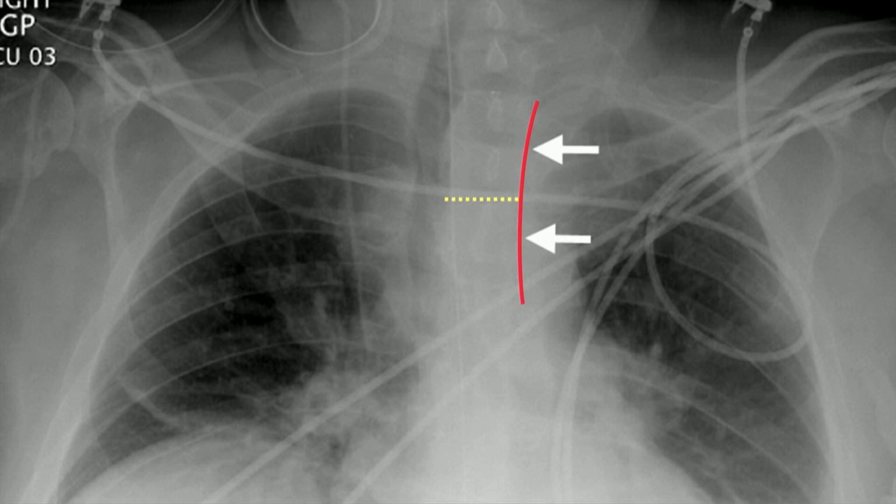So here we have a case where, again, we can see the air in the trachea, but we don't see the stripe. Instead, we have this thickened area denoted by that yellow dotted line before we actually get to an interface. And this is thickening of the left paratracheal stripe.